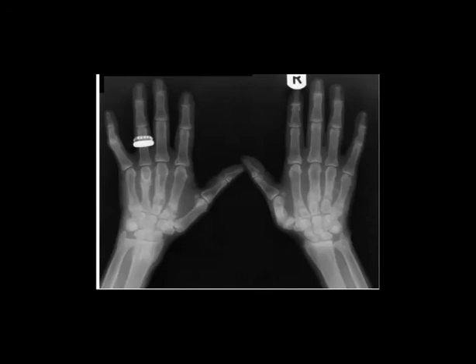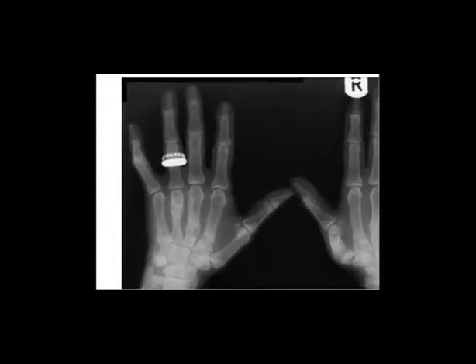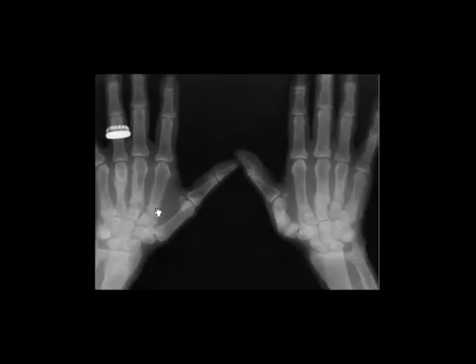So now try to think what can you do after. And this fracture, if you look carefully, you will find there's some sclerosis through the adjacent bones.